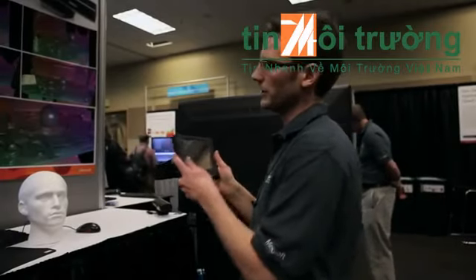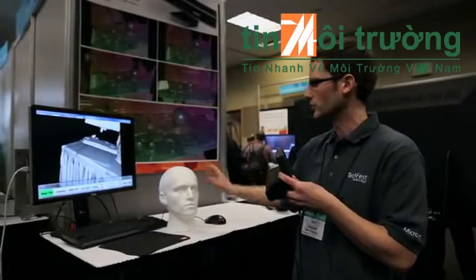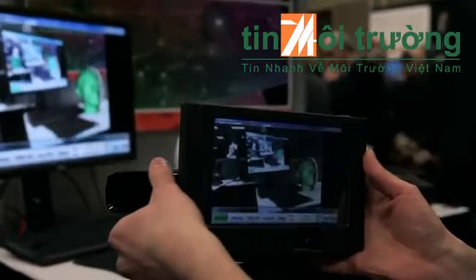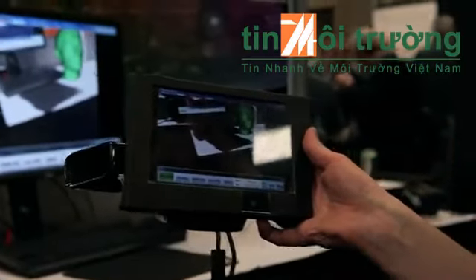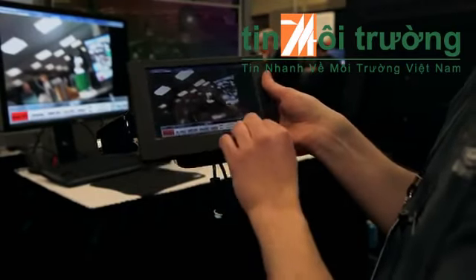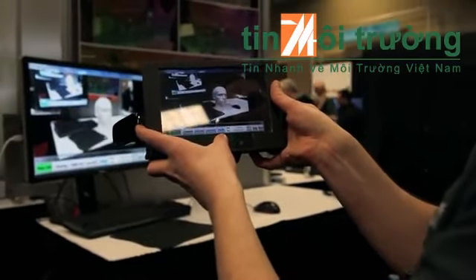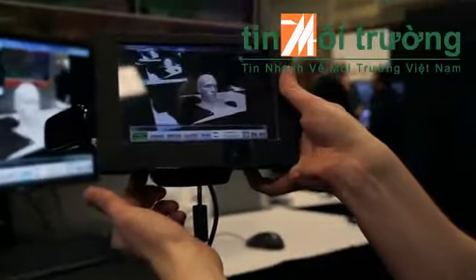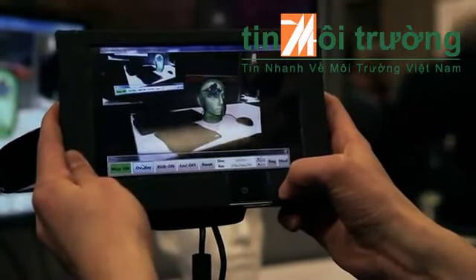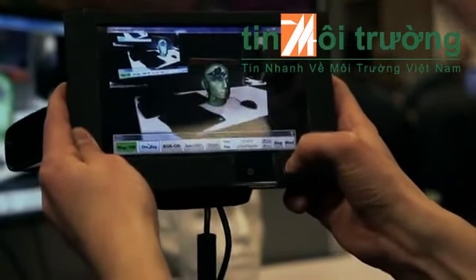So what I show you here is, imagine this is a patient's head in the operating room, and I need to do some surgery on the brain. So what I have here is a regular Kinect device, a sensor, which you can buy in the stores. And we just attached a USB-powered touchscreen device, which enables us to see from this position, basically, the world as you would see it from the sensor.